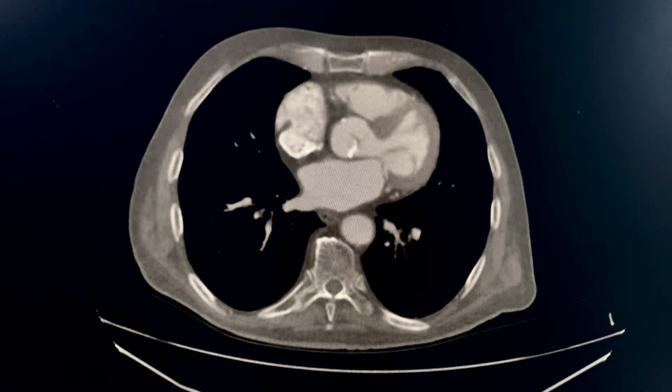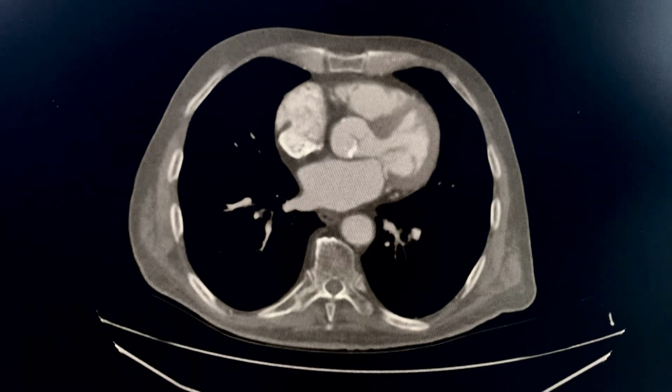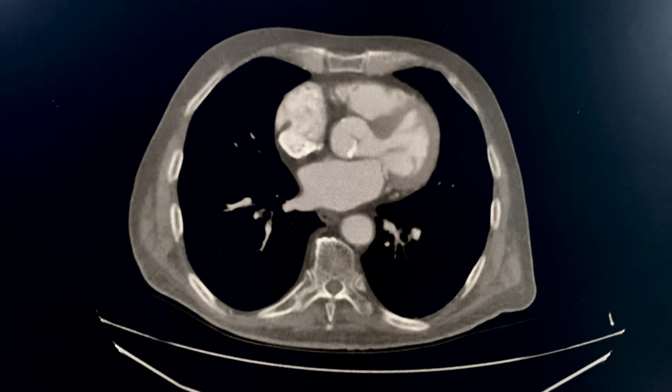The patient has a history of atrial fibrillation, AF, and in our setting, AF is a common etiology of acute limb ischemia, which means it's most likely his AF caused these sudden acute changes.